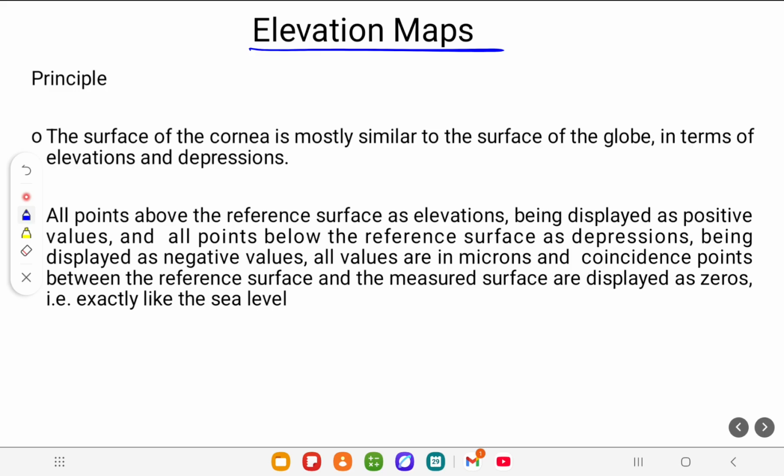And whenever I am analyzing for refractive surgery, I always choose to see how the posterior elevation is, and that matters. Okay, so of the four maps I always go to posterior elevation first. Okay, fine.